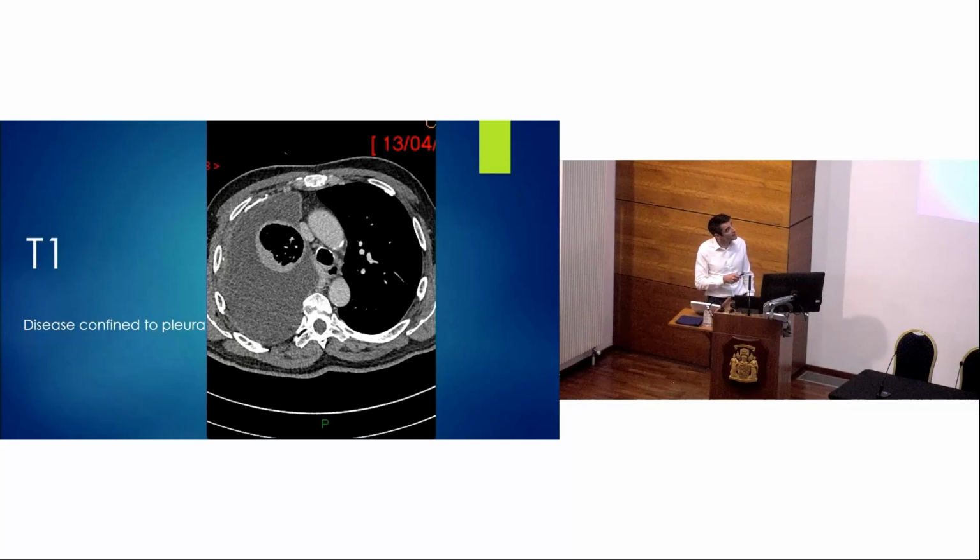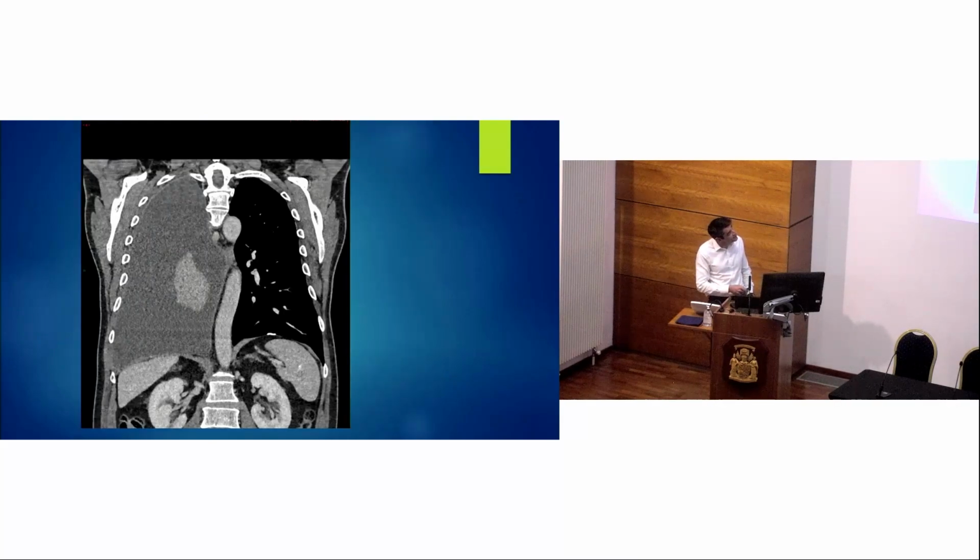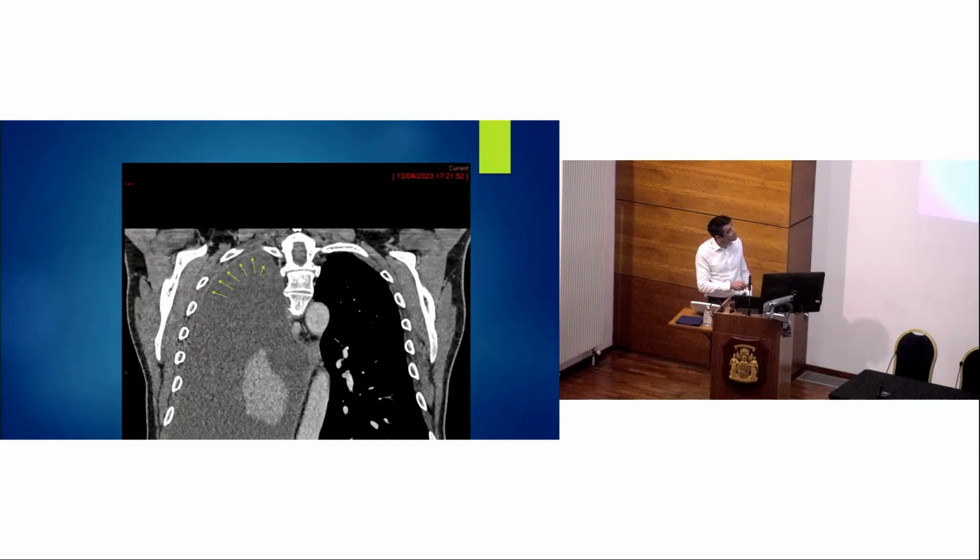And then if we inspect this area here, that I drew your eye to before, on this side, again, no discernible structure between lung and mediastinum, but here now we've got this thin rim of soft tissue thickening there, and that's indicative of tumour, and that's this tumour that's confined to the pleura alone, and this is what we have as T1 disease. Again, same patient, in the coronal plane this time, and I think with the benefit of these arrows, you can see there's a slender rim of tissue there now, outlining that thorax, and that's the early T1 disease that we see in CT.